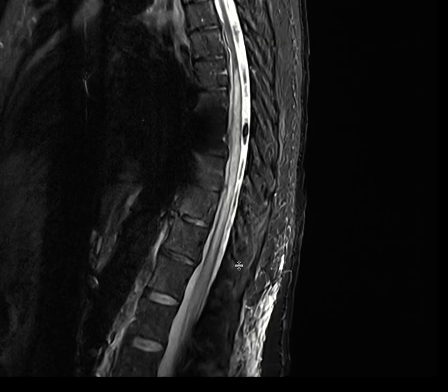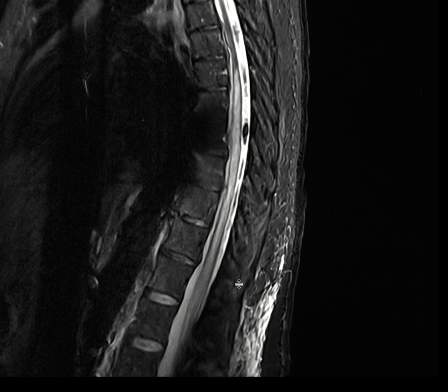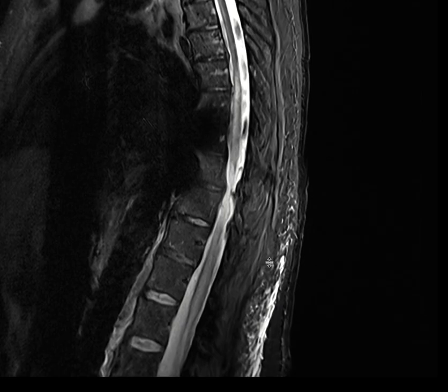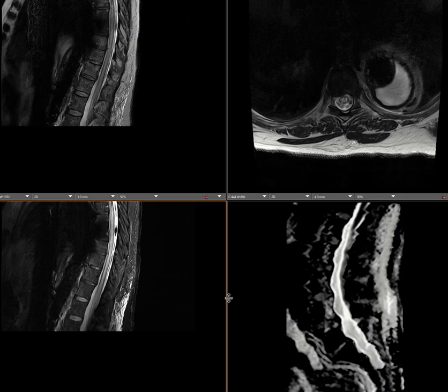This study was done without contrast because the patient was sick, but if we do contrast in these patients, it's not going to enhance. As we know, if this patient had anything like myelitis or infectious, inflammatory myelopathy, or a demyelinating process, it would have some sort of enhancement. But this entity, a cord infarct, shows just T2 abnormal signal, which looks like expansion of the cord without apparent enhancement.